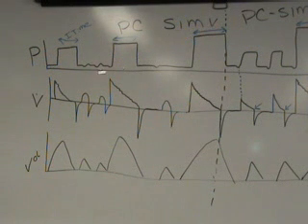Well, in SIMV, remember, SIMV allows for spontaneous breathing. So here I have some spontaneous breathing that's occurring between these two breaths. And if I look at the flow pattern with that, they don't assume a decelerating flow pattern like the pressure breaths do. They're a sinusoidal flow pattern. Okay, they're not perfectly the same because they're spontaneous flow patterns, right? We breathe in a sinusoidal flow pattern naturally. And you see that the volumes delivered are less with those spontaneous breaths because they're not having a big pressure that's augmenting them.